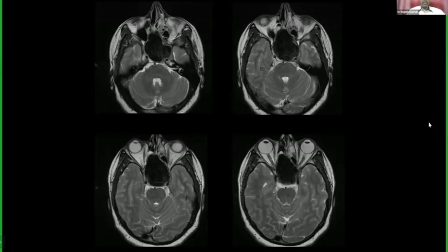Okay, and any high protein material. Okay, so just a retention cyst usually doesn't expand the cell so much. Now any polyp having a high protein content can appear dark. Okay, and what about mucocele? Will it appear dark on T2? Mucocele appears bright on T2.